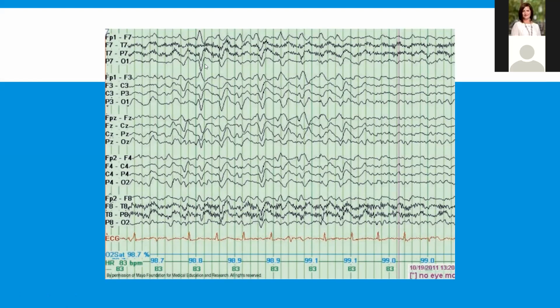This is tricky. So there's definitely slowing. I'm looking at comments. So the question is, is this seizure? Is this slowing? I definitely agree, the background is slow. Everything is moving very slowly. So there's definitely slowing.